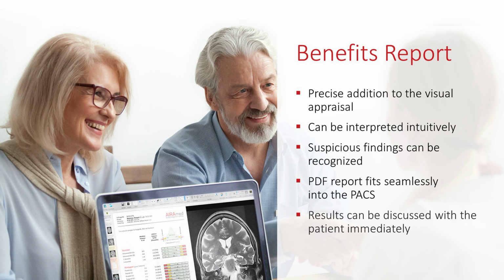It can be interpreted intuitively, and the suspicious findings can be recognized immediately in the summary. The PDF report fits seamlessly into the PACS report and can be easily exported at any time, and the results can be discussed with the patient immediately.